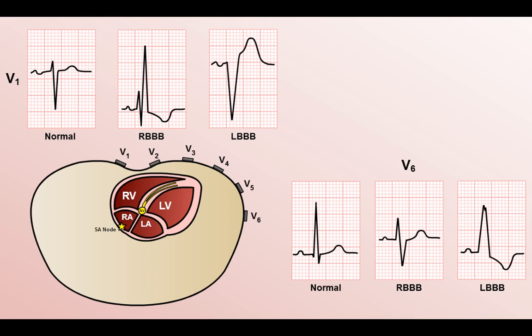Remember that lead V6 points in roughly the same direction as leads 1 and AVL, so that these leads usually show the same changes seen here.